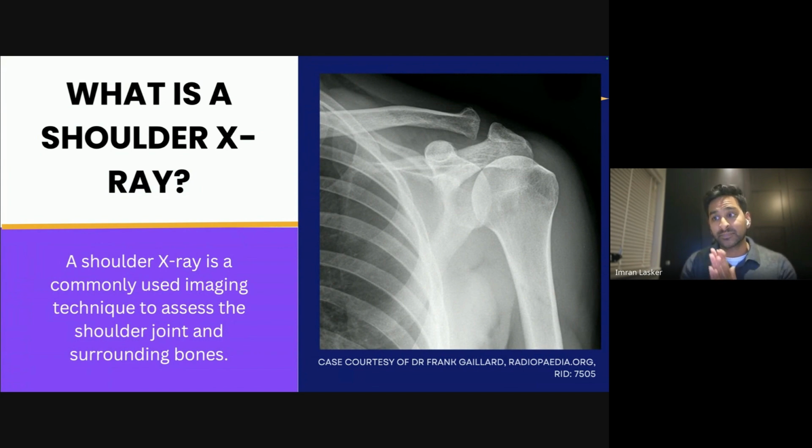So this is actually particularly useful if you are in A&E and that kind of thing as well, because you're going to get lots of people who've fallen over, hurt the shoulder, and potentially fractured themselves. So X-rays are very, very common. Obviously, chest X-rays are the most common thing in an A&E environment, but shoulder X-rays are very, very common. The mobility of the shoulder means it's more prone to injuries.